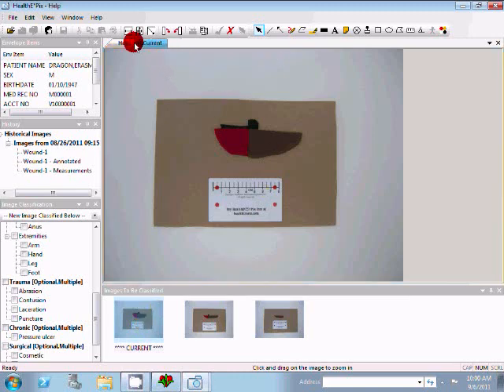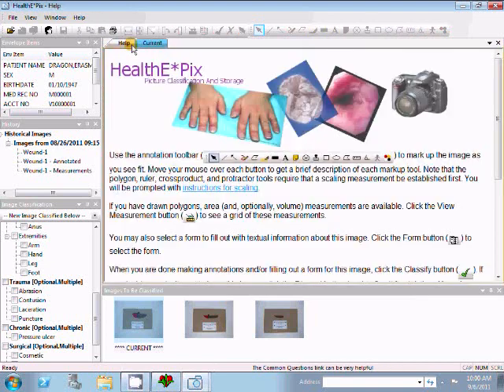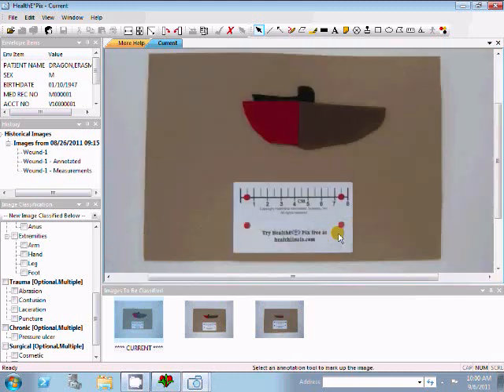The images we've made for this demonstration are obviously fake wound pictures. We didn't want to use actual pictures for reasons of patient confidentiality, and we wanted something to demonstrate different tissue types and wound sizes. That's why the images look a little peculiar.